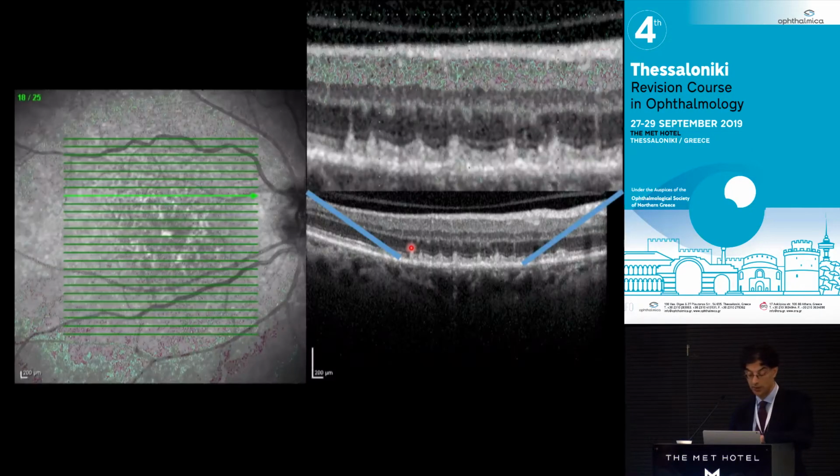It's above the native RPE. And then there's the more common peaked form, again above the RPE. It breaks through the ellipsoid zone and through the external limiting membrane here. These patients often have thinner choroids. They have more night dark adaptation problems. They're more prone to GA and more prone to RAP. And these are the ones that you treat for wet AMD, and they're the ones that within 2 years often develop geographic atrophy. And so not great.